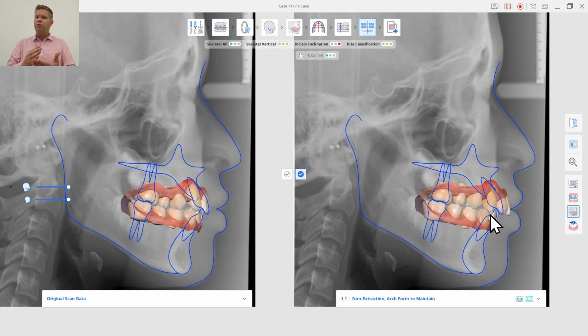So with everything going smoothly, this again should take about 2.5 minutes. Now we're going to transition to start talking about when unique situations arise and the software needs you to override some of the artificial intelligence.